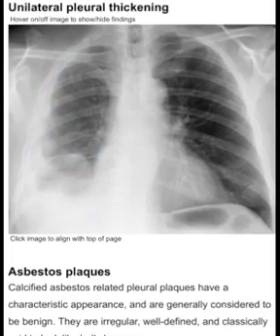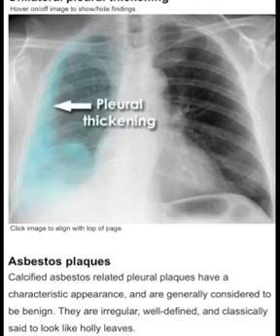Unilateral pleural thickening, lobulated peripheral shadowing on the right, loss of right lung volume, shadowing over the whole right lung due to circumferential pleural thickening. Clinical information: shortness of breath and right side chest pain, history of asbestos exposure. Diagnosis is biopsy results showed this to be a mesothelioma, a malignancy of the pleura caused by exposure to the asbestos.